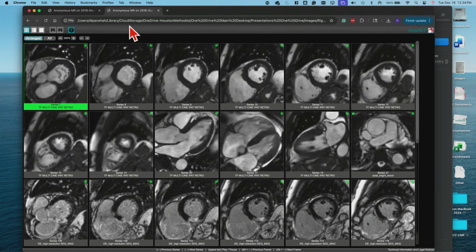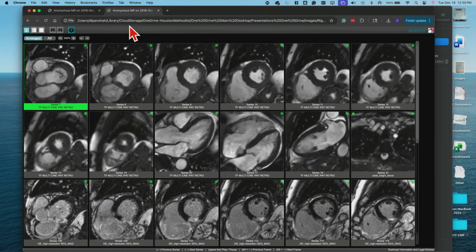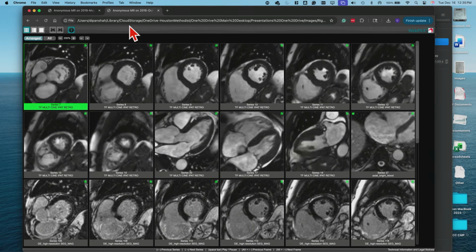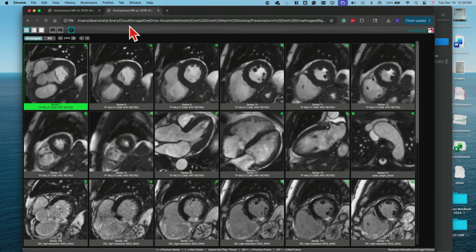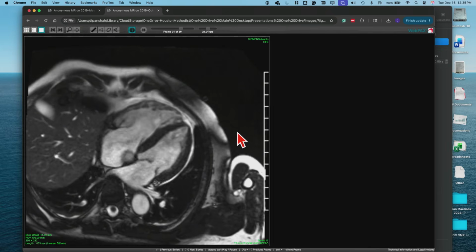Right. Okay, so RV is very big. Okay. And where do you see that? Because by definition, can the RV be dyskinetic everywhere? Right. In 17, let's see. Yes. Okay. So you're seeing this area right here?